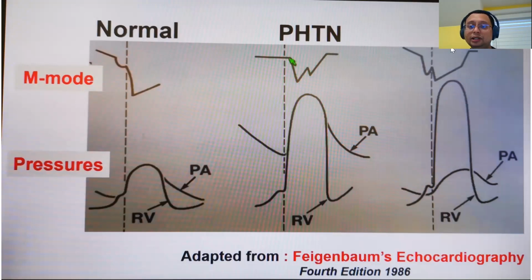In pulmonary stenosis it is different. Remember, pulmonary stenosis usually is protective against pulmonary hypertension. So you can see that you have something that looks a little bit different. You can see that the initial part is smaller than the later part, compared to pulmonary hypertension, in which the initial part is bigger than the later part. So this is the flying W sign of pulmonary hypertension. So you have notching by pulse wave, flying W by M mode, and sometimes in continuous wave Doppler, you can see higher diastolic ending of that regurgitation flow. If you have any question, you can ask me at the end.